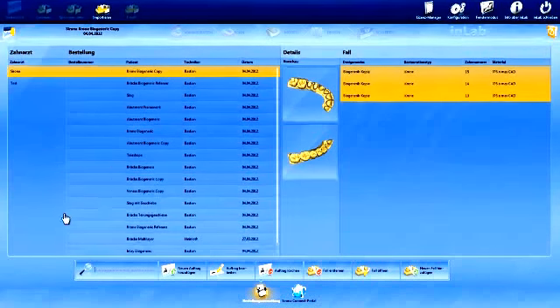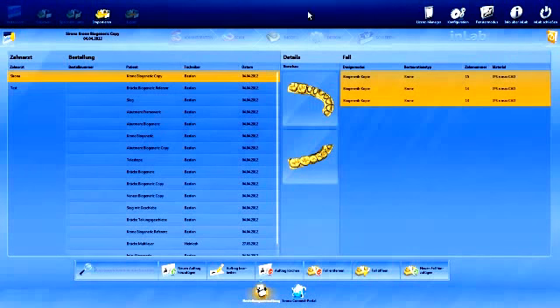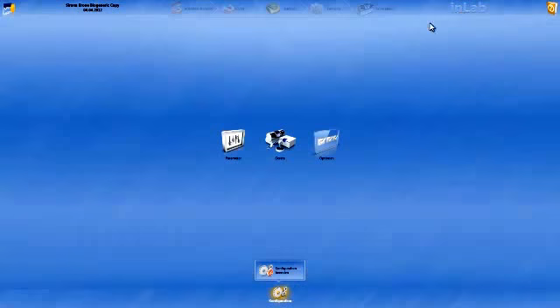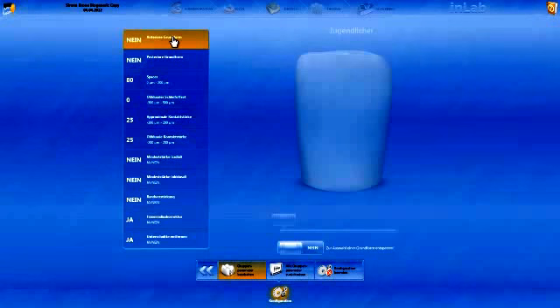I also have the option of defining the parameters individually. For this, I click on Configuration and Parameters. The respective indications. In the left-hand window, we can see all the active parameters which are necessary for restoration of a crown. The posterior and anterior teeth are currently set to biogenerics.